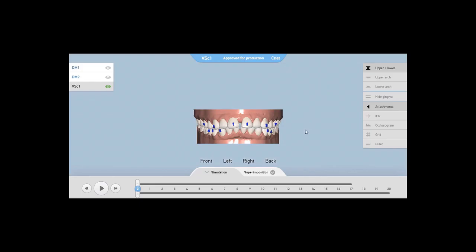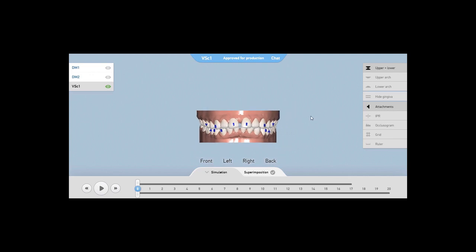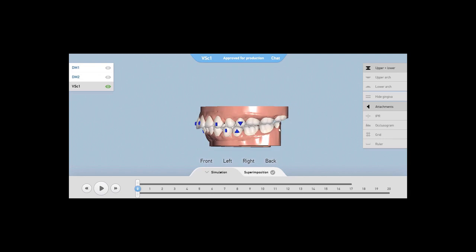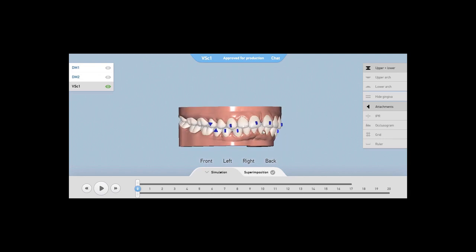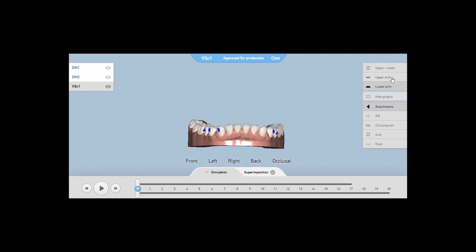Welcome. In this lesson, we are going to look at the tremas and diastemas treatment, and this example will show us the advantages of aligner treatment. The virtual setup is of a patient whose main concern was the spacings between the frontal teeth. We can examine the setup from different angles, and we can clearly see the diastema between the centrals and the tremas, on both the upper and the lower arch.